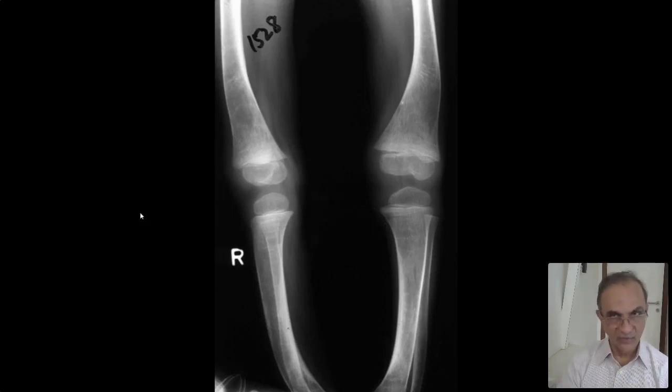This is pathognomonic. I don't even know the pronunciation of that. I think pathognomonic, something like that. Yeah, pathognomonic is wrong. So it doesn't look like rickets, but it is healed rickets. And the only thing that the patient needs, if this type of varus angulation comes in the way of normal activity, is corrective osteotomy, right? Nothing more. You can't give tons of vitamin D now.